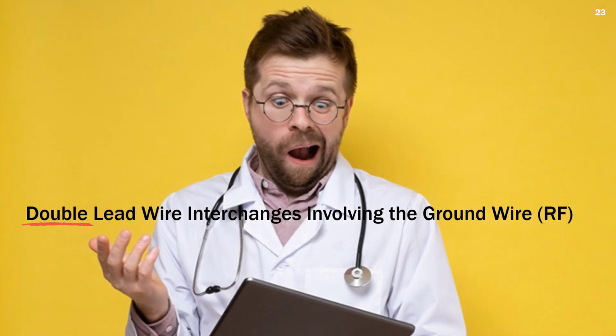Okay, so we saw a lead wire interchange that resulted in an isoelectric baseline in lead 2, and then we saw another, a single lead wire interchange, that resulted in a near isoelectric baseline in lead 3. But what about lead 1? That's actually going to take a double lead wire interchange to get the same type of baseline in lead 1. So we're going to talk about a double lead wire interchange, which includes the ground wire.